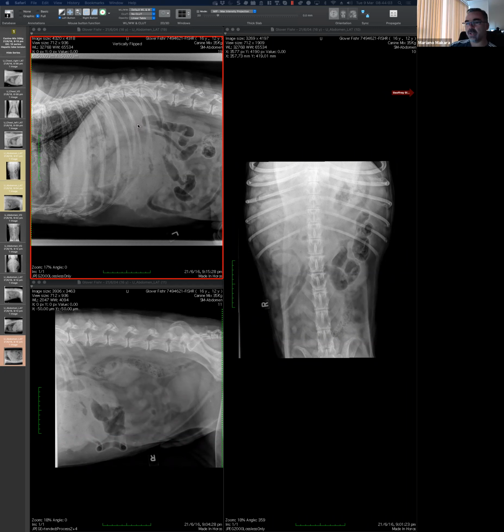So one of the rules that it's breaking, at least the rule that I love, but I always bring the exception to the rule, is that lesions in the liver displace the stomach caudally. That is a rule, and it works most of the time. In this case, it didn't work. I suppose it has to do with the torsion, and then it probably moved caudally, and then it grew, got bigger, and couldn't come back. Maybe because it's the right, I don't know, but it broke that rule.